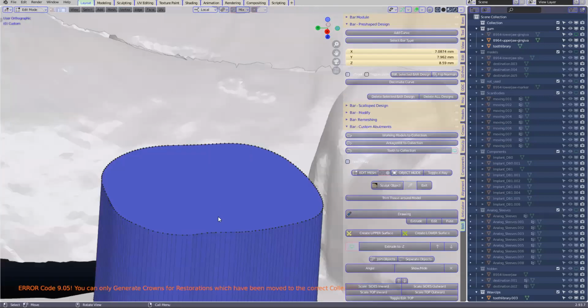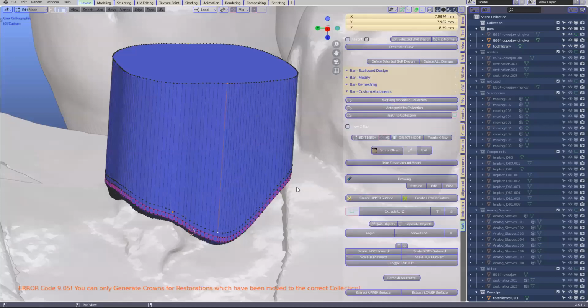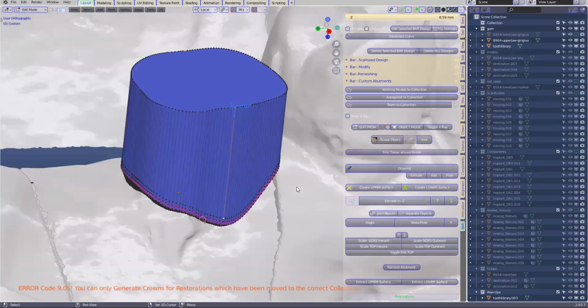So this is easy to do when you understand how it works. We're going to make an angle and we're going to view it. This is 90 degrees at this stage. Now, wait, let the indicator come up, Michael. It hasn't come up yet. That's a long delay, actually. Yeah, now we can see the angle indicator, which says 90 degrees.